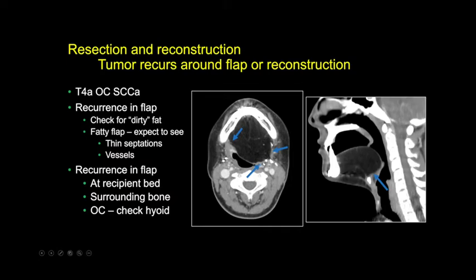No nodularity, no mass, and no abnormal enhancement. And then laterally, we're going to look for the same thing, nodularity, and this looks very clean. Notice that the flap has been used to reconstruct the anterior wall of the swallowing tube, if you will, the neopharynx, and it's anastomosed laterally and medially to the normal tissues. That's the new anterior wall of the neopharynx.